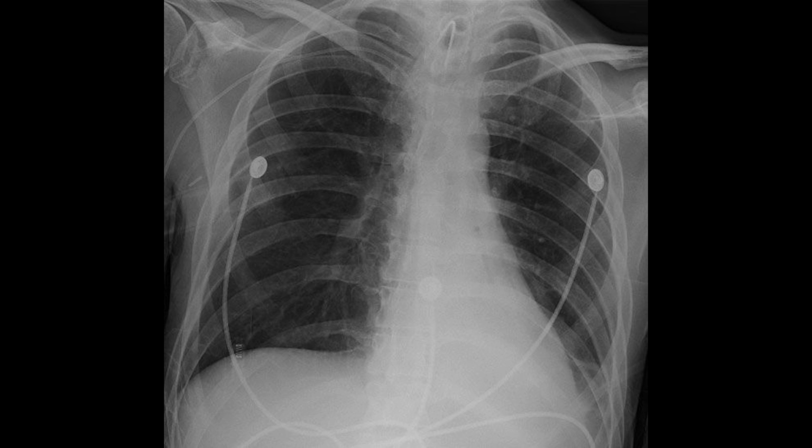This is a chest radiograph of a young man with myasthenia gravis who presented with hypoxia. The initial film shows a retrocardiac opacity with visible air bronchograms and narrowing of the intercostal spaces on the left, indicating volume loss. The left hemidiaphragm is not seen behind the heart, and the left heart border appears abnormally straightened. The left hilum is displaced inferiorly. These findings are characteristic of left lower lobe collapse, most likely secondary to a mucus plug.